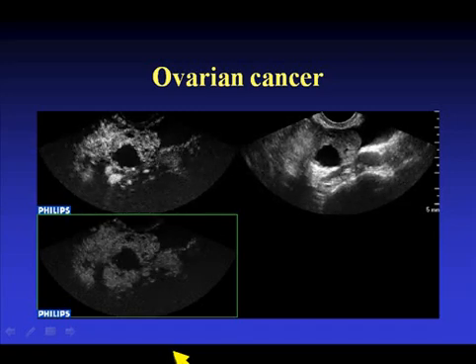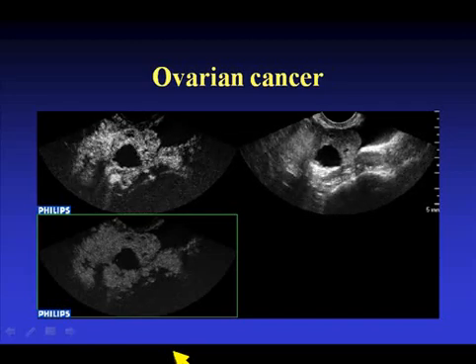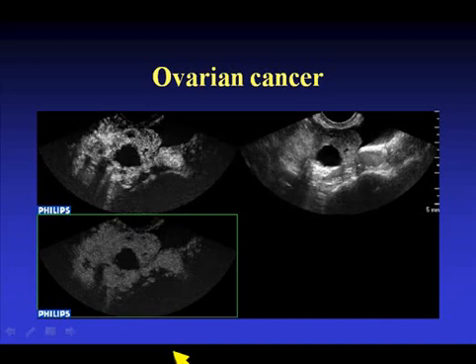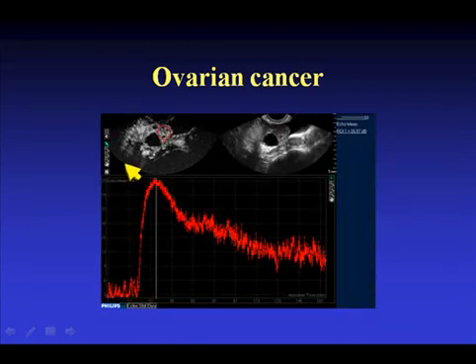There's a very large enhancement. And we can see from the time activity curve a very high peak intensity and a very long washout phase.